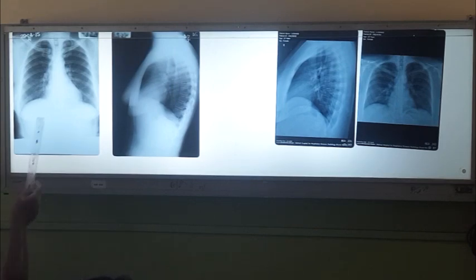And if you can't see the intervertebral disc through the cardiac shadow, everything will be whitish, and all these whitish areas may be due to soft tissue shadows there and may not be inflammatory shadows. Okay, so exposure is important. So look for everything before reading the X-ray, right?